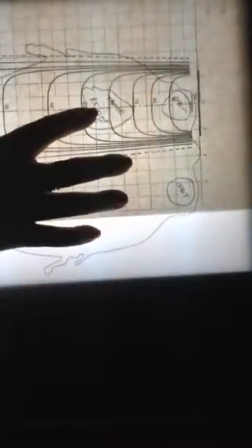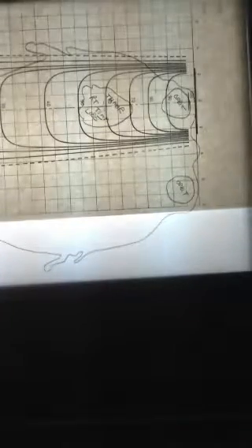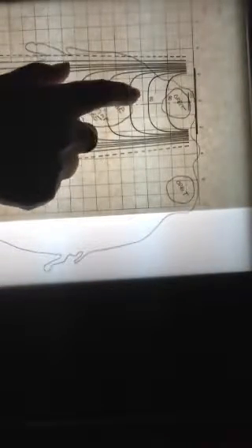So since this tumor is here on the right side of the head, I'm going to try to put one beam through the AP and the other beam through the right lateral. So as previously shown, I'm going to line up my central axis on my isodose chart, put the T at the beginning of tissue. I'm not going to use line shift correction on this one. If I were doing this for real, like manual treatment planning, I would have to shift these lines as I showed you before and have that represent the AP beam.